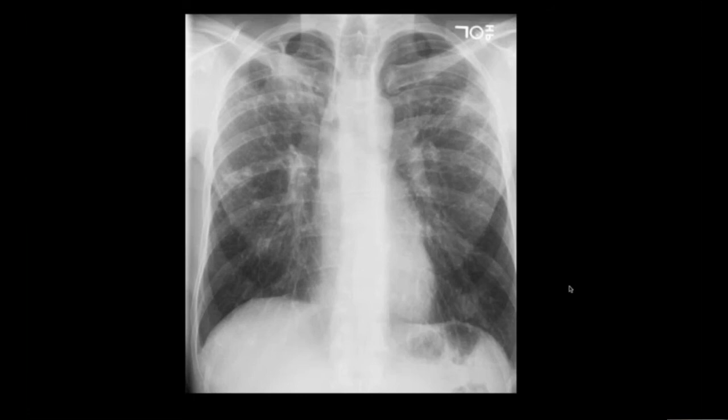This frontal chest radiograph is showing irregular opacities, scarring, and bronchiectasis in the upper zones. You can see tram track lines, as well as cystic changes representing the end-on appearances of the bronchiectasis. There's volume loss of the upper zones or upper lobe, causing elevation of the hila. So this is in keeping with upper lobe fibrosis. Differential diagnoses include cystic fibrosis, pulmonary tuberculosis, sarcoidosis, and pulmonary changes of ankylosing spondylitis.